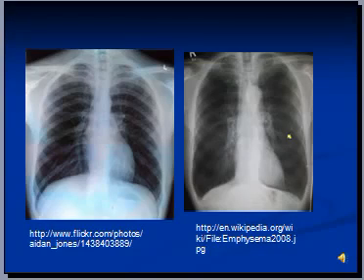Now, emphysema can also be a result of a few other pathologies, but air trapping is the one feature which will always be present, and structural changes as a result of air trapping and damage will always be visible on a chest X-ray. The X-ray on your left hand side is normal, while the lungs are emphysematous in the X-ray on your right hand side. The radiologic features of emphysema are hyperinflated lung. So the lungs in this X-ray are hyperinflated. The rule of thumb is that the lung tissue should not be visible beyond the 7th anterior rib.